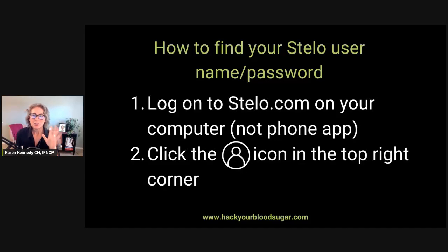You guys, I wanted to show you a really important trick that I just figured out while I was creating some content for my clients about when you want to share your Stelo data, and open a Clarity account, connect them and share your data with a clinic. We didn't know how to find your username and password on the Dexcom Stelo. You could see the username, but you couldn't see the password. It was hidden on your app.